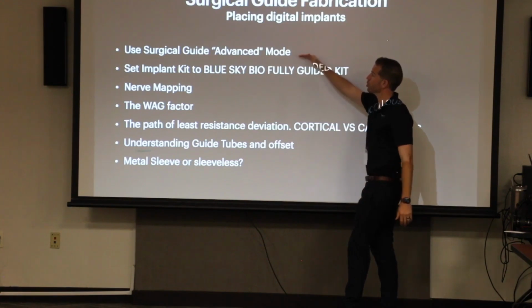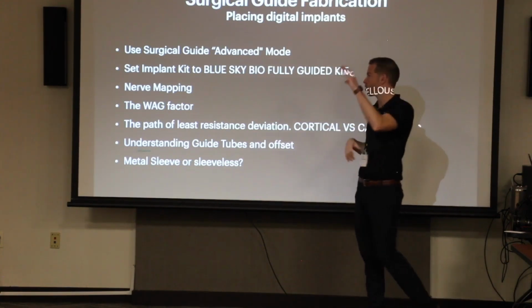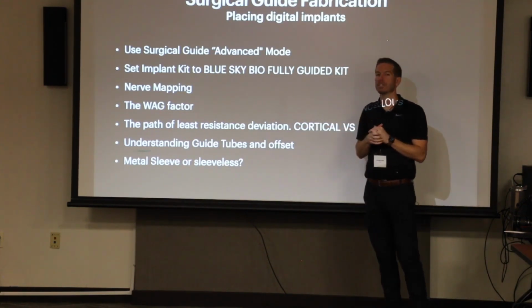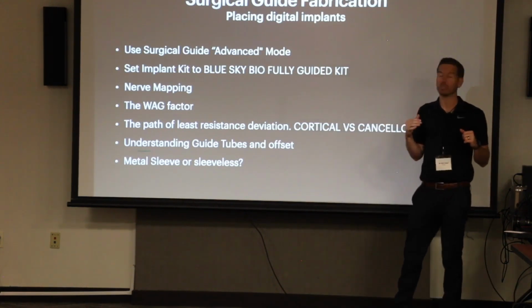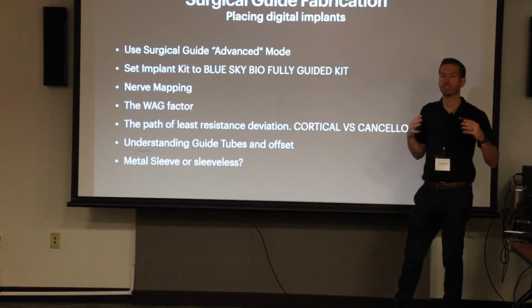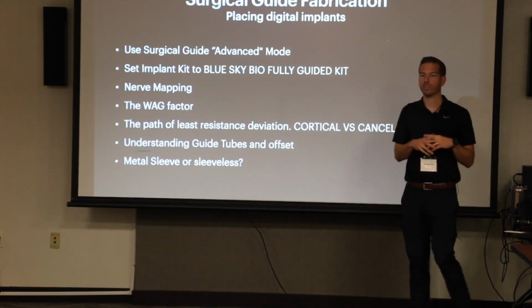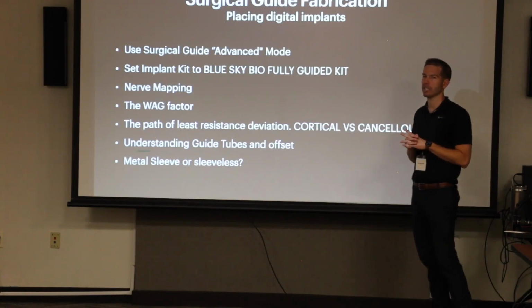So in surgical guide, there's different modules we talked about. There's the denture module, the surgical guide module, the model editing. I like getting everybody used to jumping into the surgical guide advanced module, because that gives us the most control. I don't find it super helpful when teaching people to start with the wizards and the basic version. I think it's best just to get into the advanced and learn the functions, because you have to be able to use those.